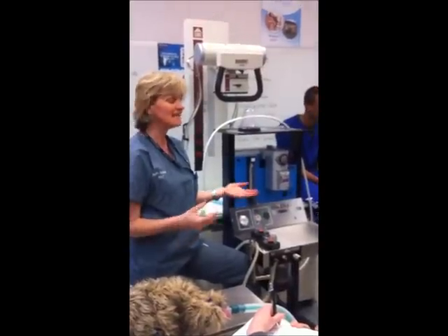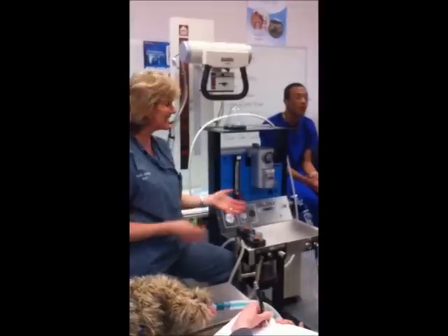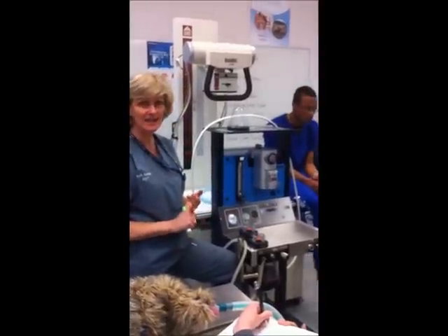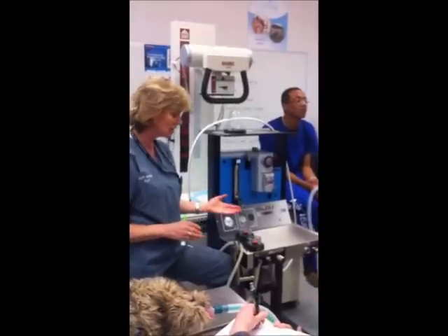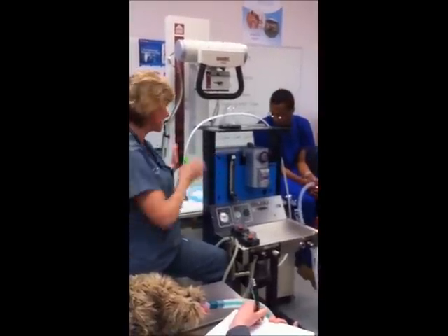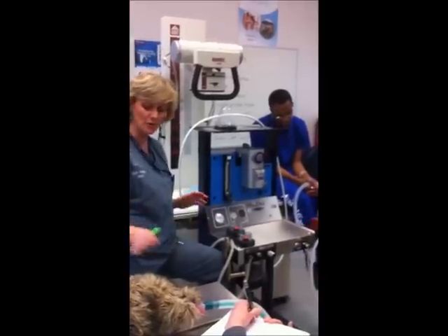How much they weigh. It's the easiest part of this whole practical because that decides rebreathing versus non-rebreathing, and it's easy. I'm not going to give you the weight in anything but kilograms, so you don't have to do conversion of pounds to kilograms. Just look. If it's over 8 kilograms, get busy. Get your rebreathing stuff ready. If it's under, get the non-rebreathing. Get it set up.